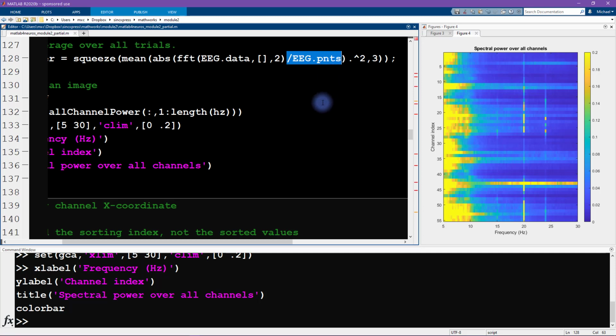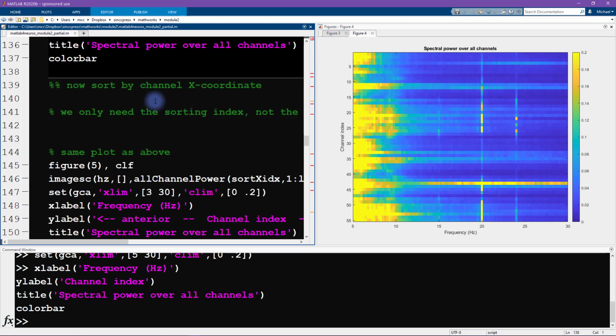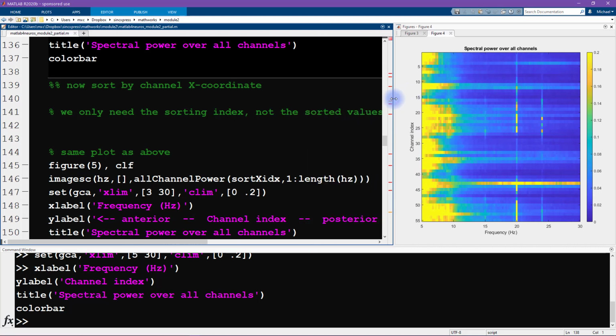normalization factors. Signal processing and statistics and data analysis and image processing is full of normalization factors. And those normalization factors are sometimes arbitrary and sometimes very important. So it's good to be aware of where there are normalization factors and when they are and aren't useful for interpreting your results. Okay, anyway, now we want to make the second graph, and that is basically the same data.